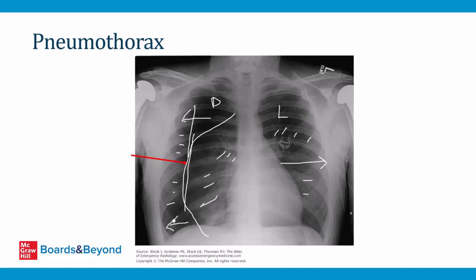But even as a med student, if you look at 2 or 3 examples of a pneumothorax, you should be able to become skilled enough to identify the border of the pneumothorax and recognize that there's no discernible lung tissue sort of out here beyond the border of the lung.